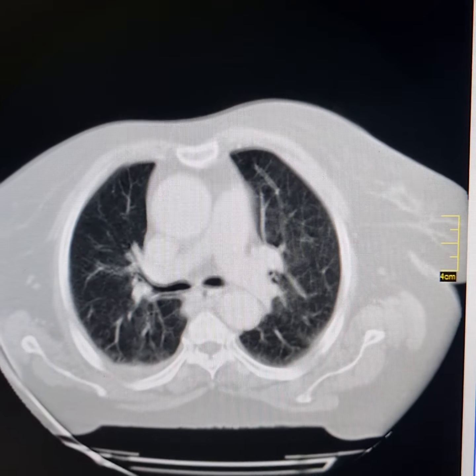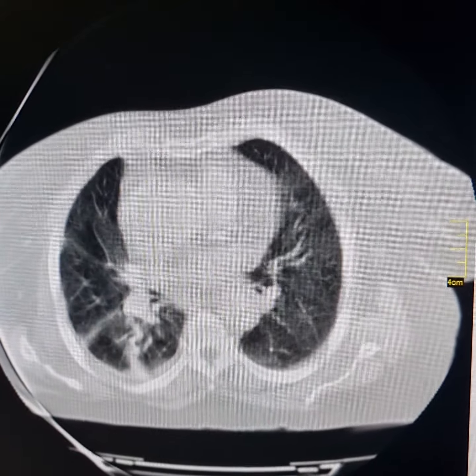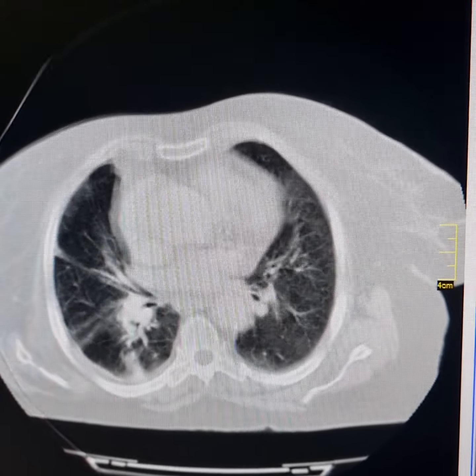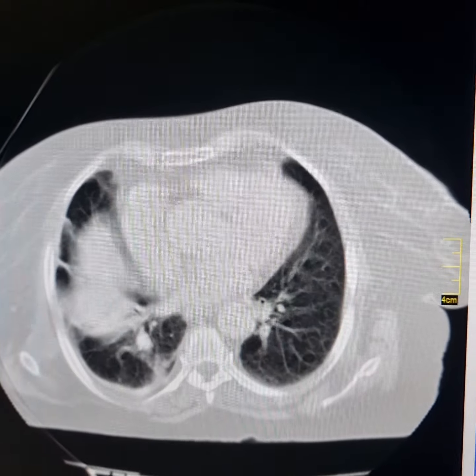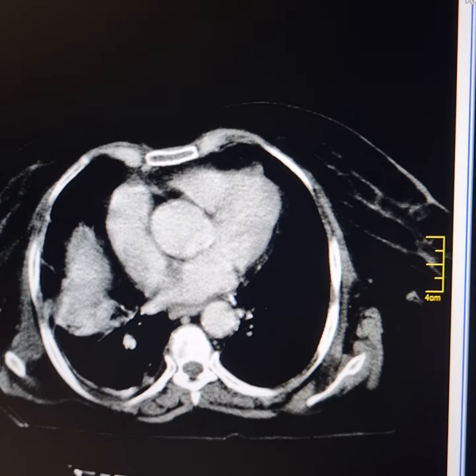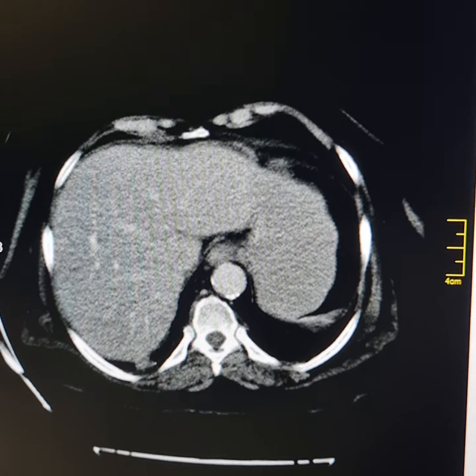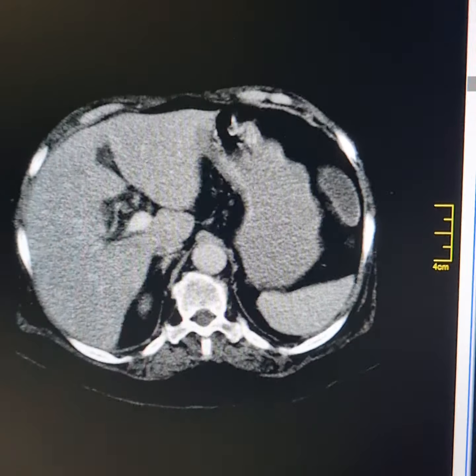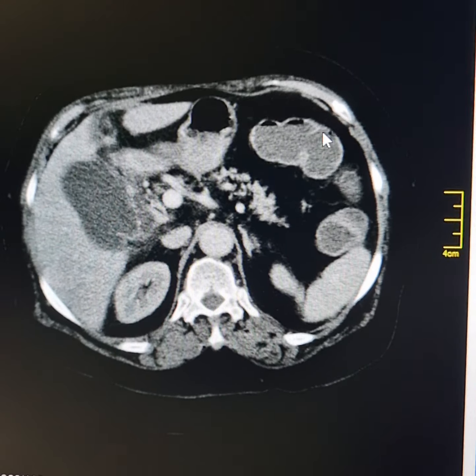This is the lung basal segments: atelectatic bands in the basal segments of the right lower lobe, along with pleural thickening along the posterior lower chest wall. She is a case of acute cholecystitis. Please observe the gallbladder is distended.